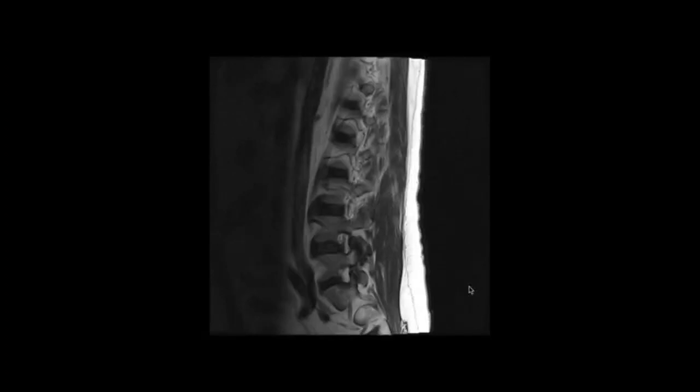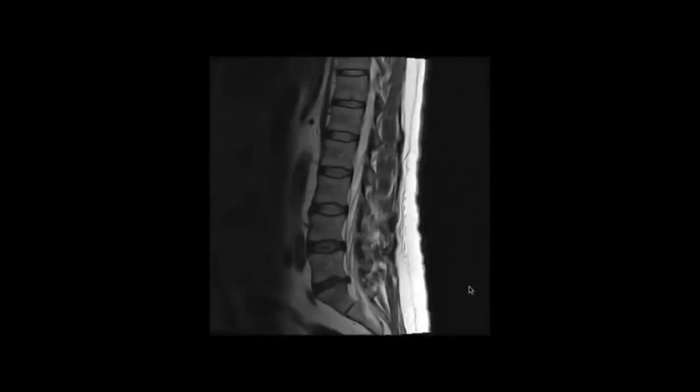So just going through what an MR scan would look like on the sagittal imaging. This is a standard T2 weighted imaging. So what you look for, in the report you put in what's the alignment of the vertebra. So the vertebra maintains normal alignment. Is there disc dehydration at any level? In this particular case, there is, at the L4, L5 level, minor disc dehydration. Same thing happening at the L5S1, which is more pronounced.